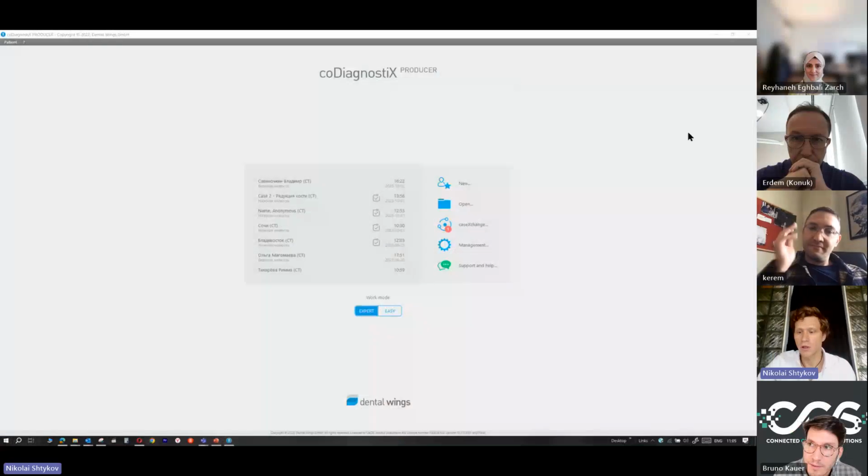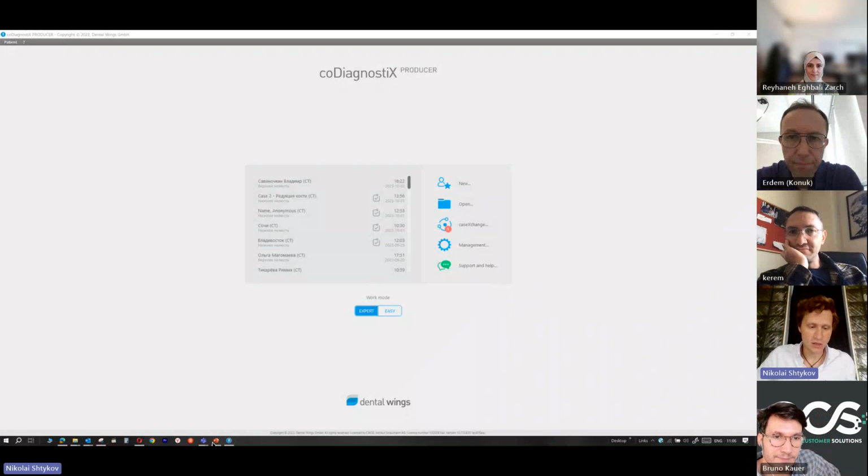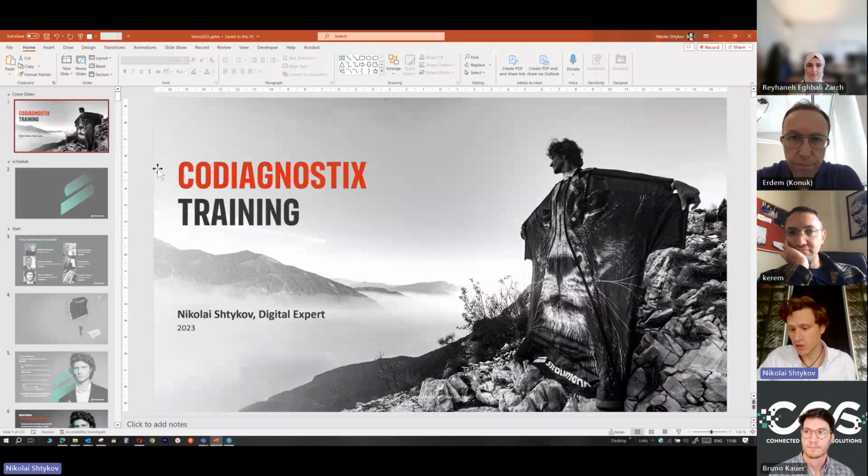Yes, I will share my screen. Yes, now you see my screen. Yes. I start from a short presentation.